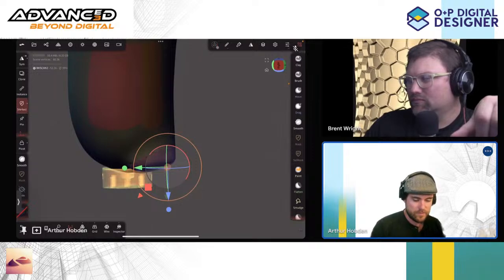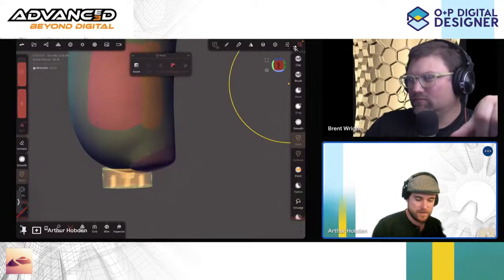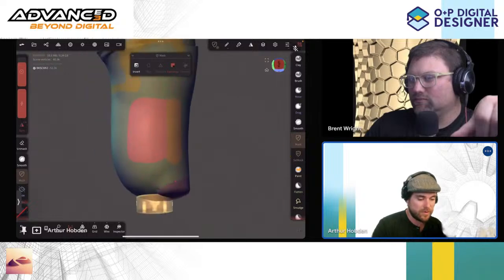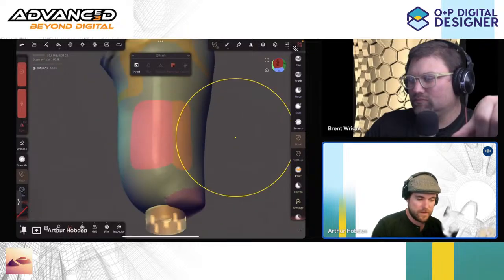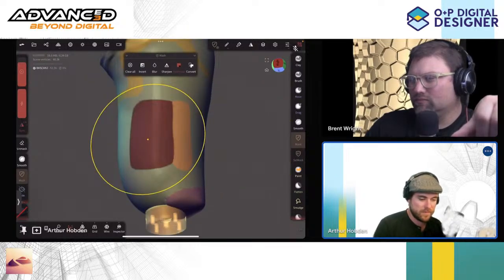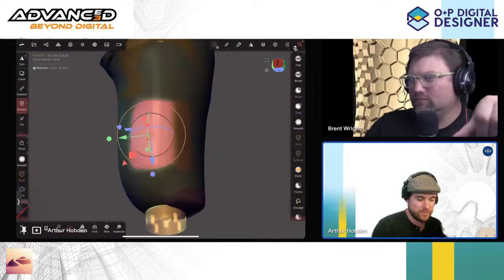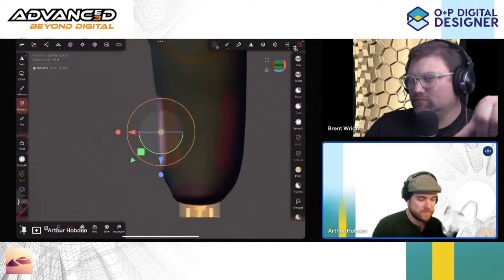If I now go to masking, we can clear the mask, and we can smooth all that out. And that will smooth out with quad meshing too. Let's try again with this one. So we'll blur, invert, select our gizmo tool. We're now moving to world space.